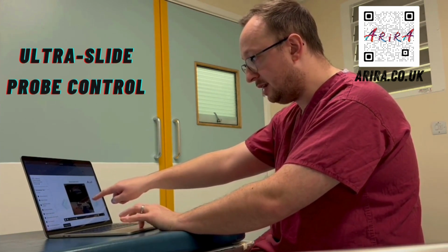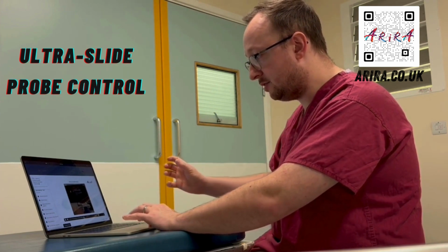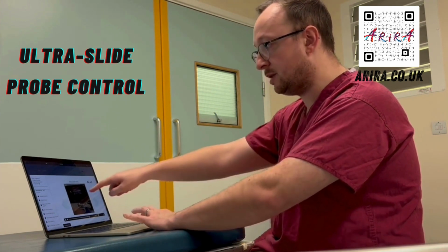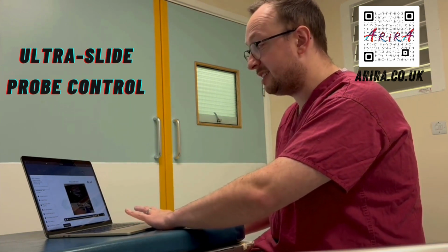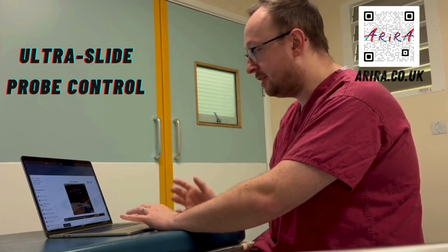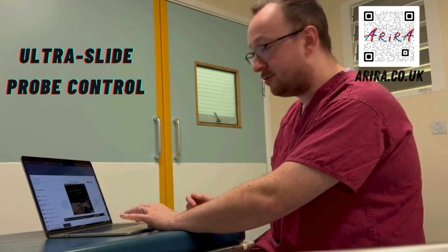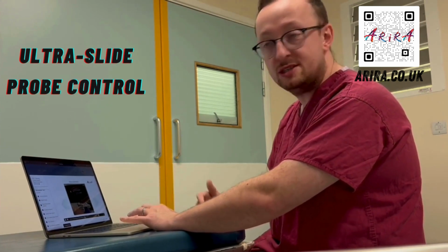So you can drag your slider along and the probe is moving along as well with a moving image of what you would see on the ultrasound. And that's really nice because we don't always get it right first time when we use ultrasound probes. So knowing what we're looking at in different positions is really helpful as well.